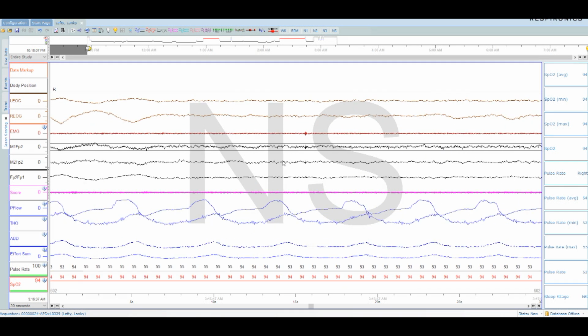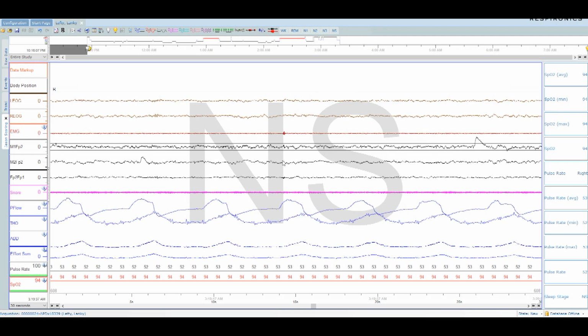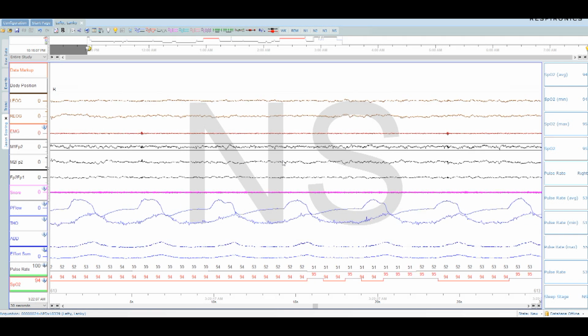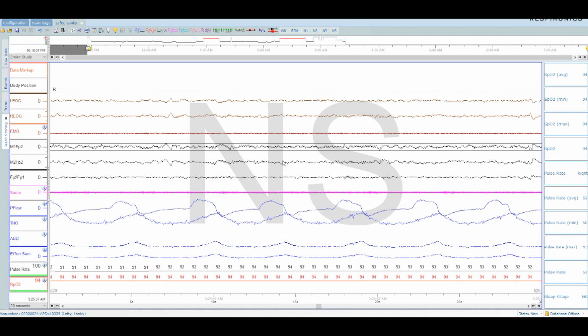This is all wake. And we have a transition to sleep right here. So sleep 1. All this is stage 1. It's looking like it's going to be REM again, and we are expecting a REM period to come up again. It's about that time to break forth the rhythm in the rhyme.